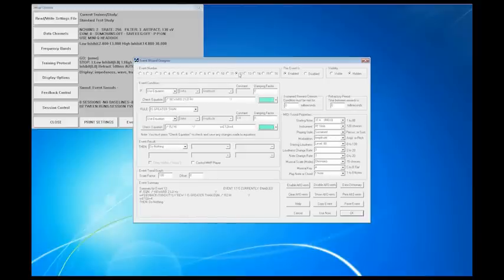And it is, I believe, these 2 files right here. Now this is where the feedback is being called. And this is the feedback minus the duty minus 100. So this is basically how we got the 2 different bands at a different level at different times.